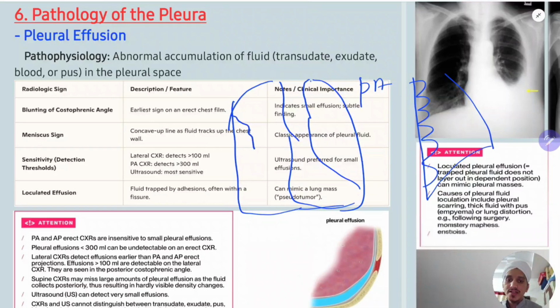Here also you can see loculation toward the side, D-shaped, in the PA chest X-ray. So here you don't see anything, but here you will see some trapping of fluid, D-shaped trapping. You see this kind of D-shaped opacities, loculations, in empyema or resolving empyema in the form of fibrothorax. You can see this type of loculations on any side. Okay, so that's the explanation of these things.